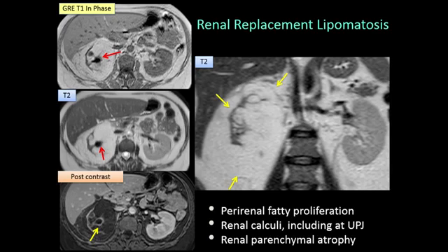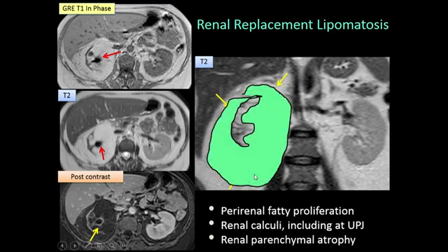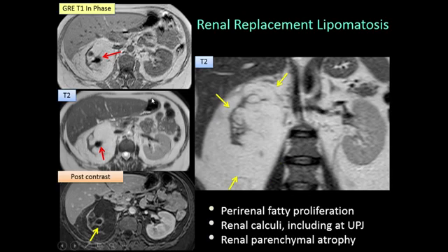So you may see on MR, this is what happens. You might say, oh, it's a chronically atrophic kidney, but not only is it atrophic, the reason for the atrophy is the long-standing staghorn calculus, the perirenal fat deposition from this long-standing stone that's not taken care of. And you can see non-function of that kidney.